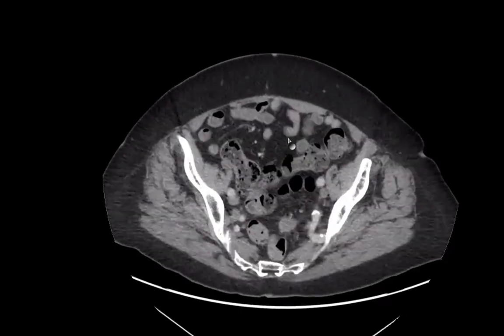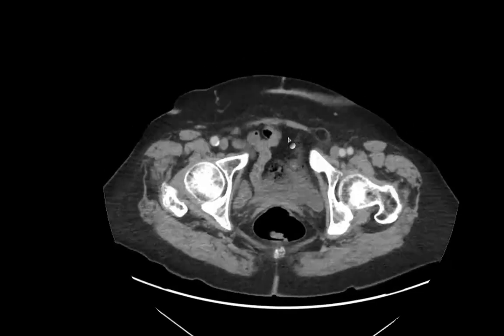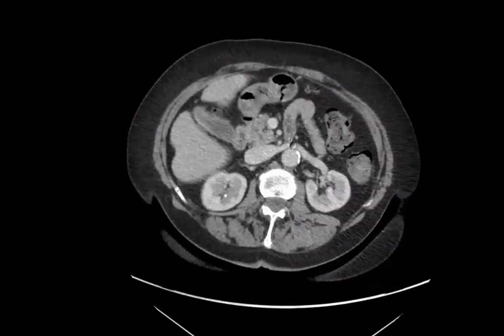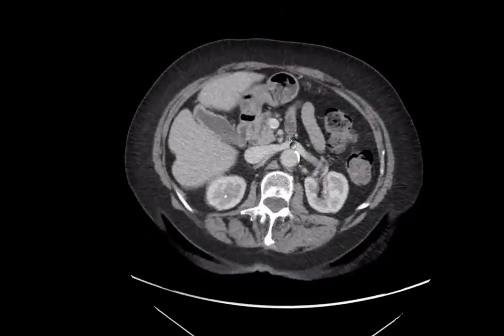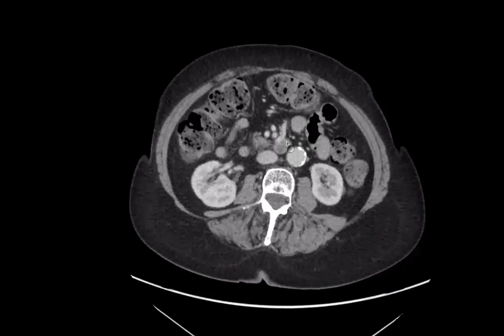Now, I'll tell you that you need to look for deposits in the abdomen and pelvis, and tell me if you can find anything. Okay, start from the top. I'm going to go very slowly so that you can go through all the quadrants in one go. Look for deposits.